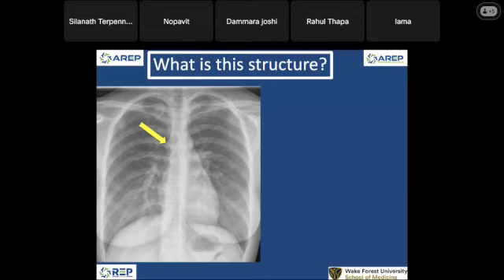It's always sitting at the tracheobronchial tree. Sometimes it can look like, maybe like you're right, just by anatomy, it can easily be a lymph node. And when we put the PICC line, sometimes we don't want it to go there. What we want is the tip in the SVC or atriocaval junction, but sometimes it just gets right in there somehow.